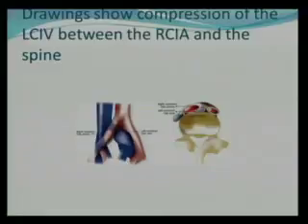How does it look on CT? This is the artery, this is the vein, and this is the fifth lumbar vertebrae. So this is how this is squishing between these two. The contralateral or the right vein is normal in caliber. Are there any questions?